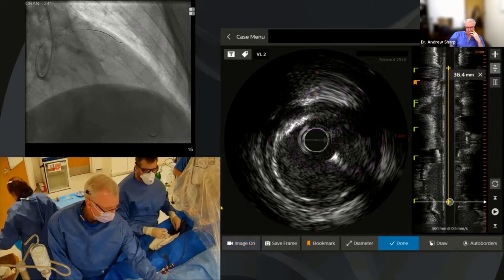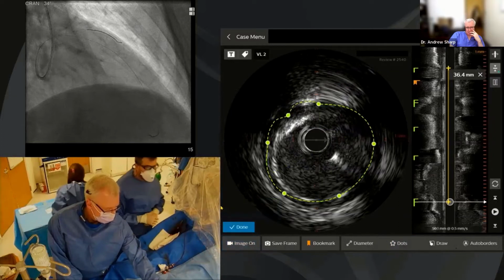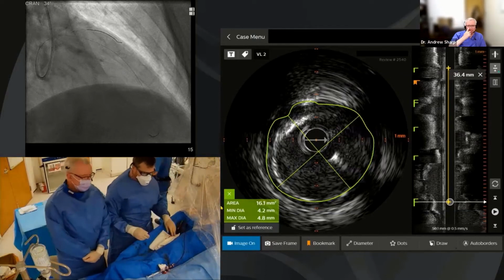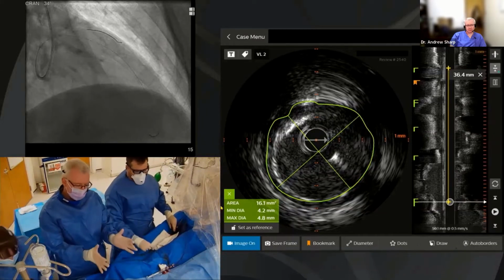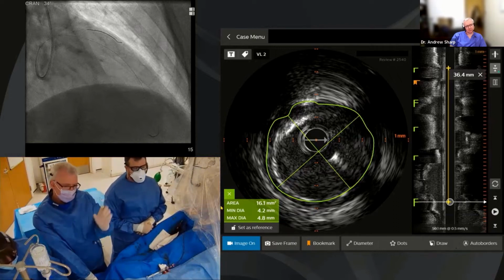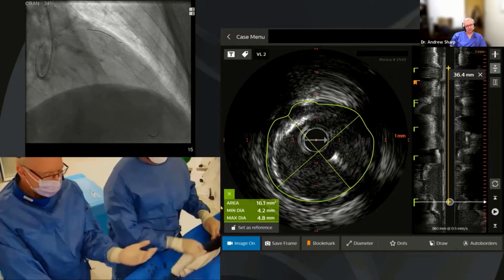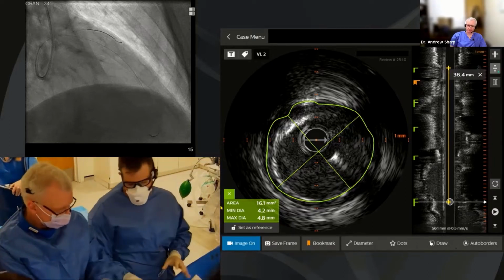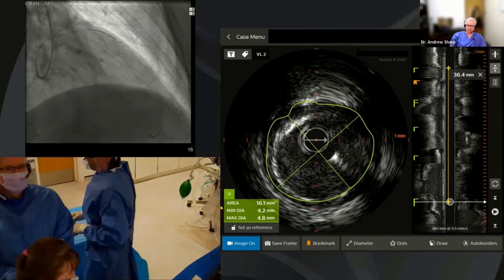let's get rid of that. Done. Got there. 38 stent. Yeah. Okay, so when we get our landing zones right, it's 36 to 38. So we'll take a 3 by 38, bearing in mind that within the body of the lesion, there's some negative remodeling and the vessel's only 3.25 at that point. We can always make a 3 bigger. Exactly. And we're looking at 4.5 roughly in the proximal vessel, and we can take this stent platform to 4.5, 4.8. Yep. So I'm comfortable with it being 3.